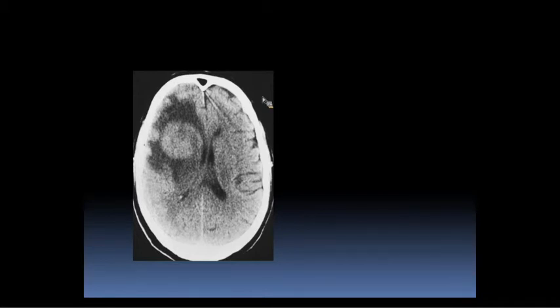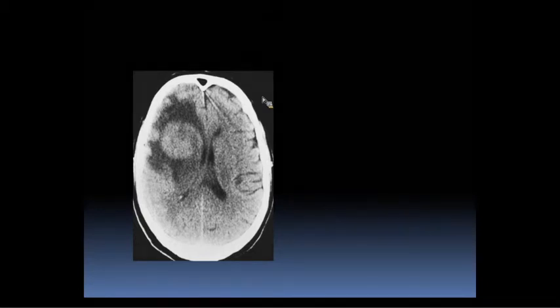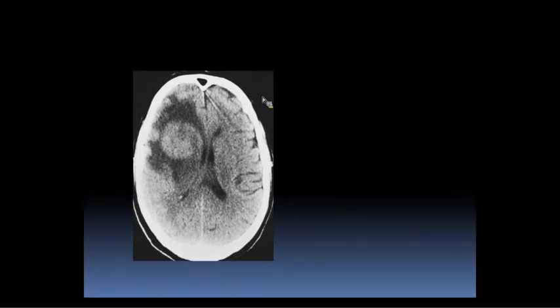So here, what are we looking at? Again, we have a vasogenic edema pattern, right? We have preservation of the cortex here. We have edema, certainly, all this hypodensity. And then we have this hyperdense area here. So is this a hemorrhage? Is this a hematoma? It certainly could be a parenchymal hematoma with surrounding edema, or it could be a hemorrhagic mass.